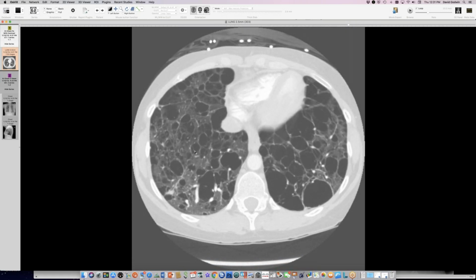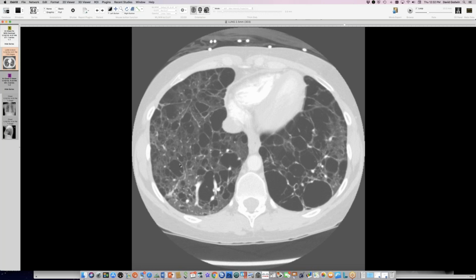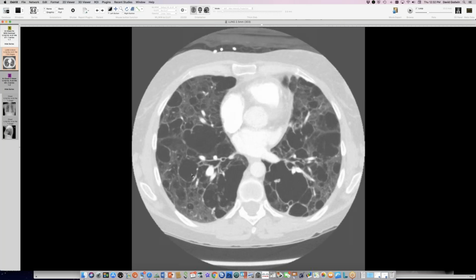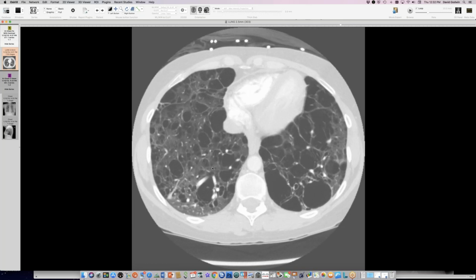I mean, there's a discrete component to this emphysema. There seems to be some pretty well-defined space. And the vessels are preserved as well, David. Yeah. So how about LAM? You like LAM? I like LAM or some other really bad cystic lung disease. I mean, there may be some emphysema admixed in there, or LIP plus emphysema.